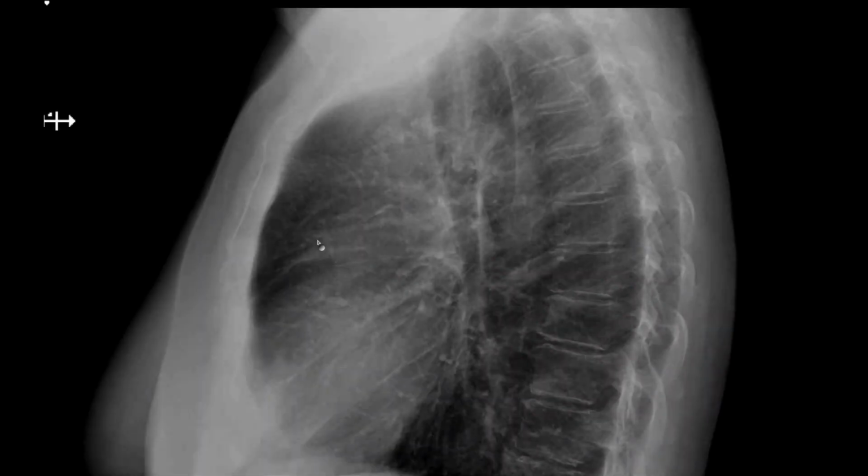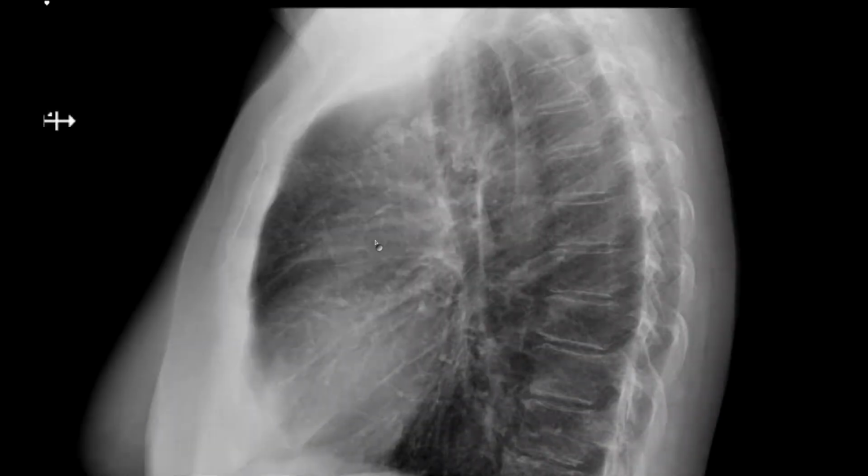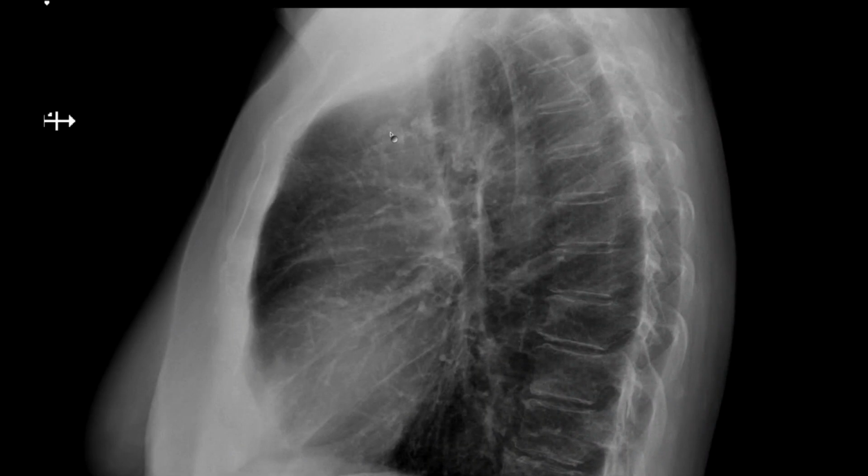So typically when I'm teaching residents, I might often ask them about something to do with anatomy. And for those of you that are looking, if I said, for example, that I think there's some calcifications here, and if so, where are they located? The calcifications right there, like here particularly, and I'm less sure about this one, but this one right there would be a great location for atheromatous calcifications in relation to origins of brachiocephalic arteries, in particular, typically going from front to back, innominate artery, and then carotid, and then left subclavian. So this is the finding of interest.